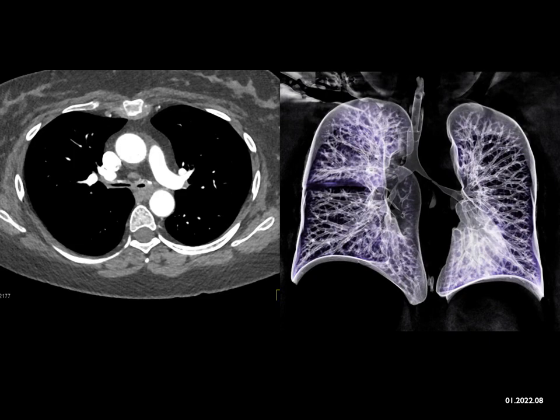Now you can say, well, maybe this is metastatic. Maybe it's metastatic breast cancer. I guess you can think about that. Maybe it's lung cancer infiltrating along the airways. But you know, the areas of involvement, which are multiple, it's a bit atypical for lung cancer. TB can give you strictures, but not diffuse infiltration of both left and right mainstem bronchi, with little else in the lung fields proper.